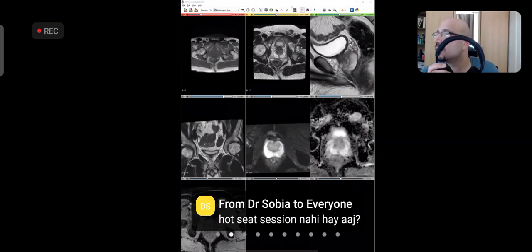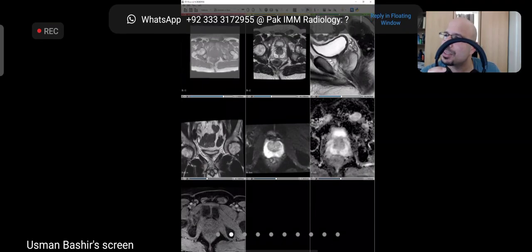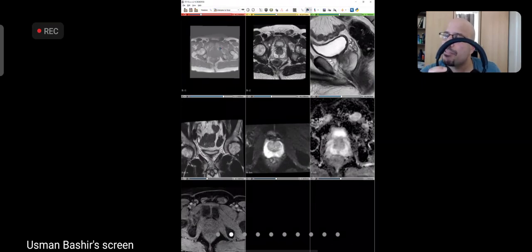Okay, so you can see that that's a pretty big field of view. You see how wide these are. Ideally, if you work closely with an MR radiographer, what I don't like is seeing all this black stuff outside. This is unnecessary. If they can prevent artifact, or if they can preserve enough signal, you should have a small field of view, just touching the skin, not too much black area.